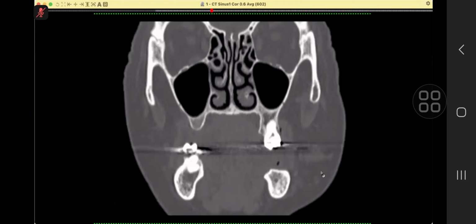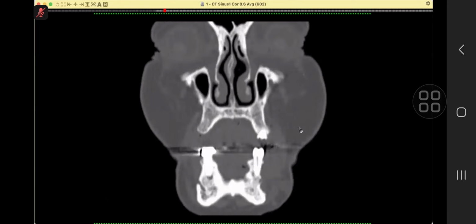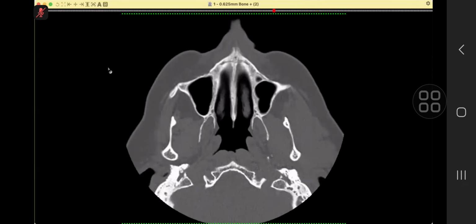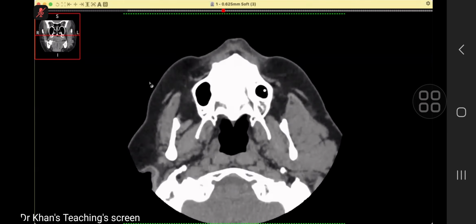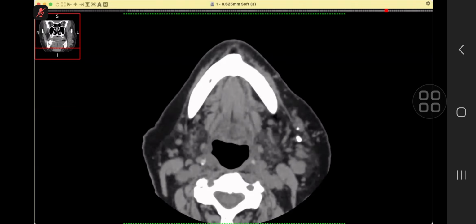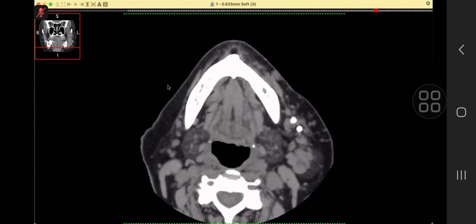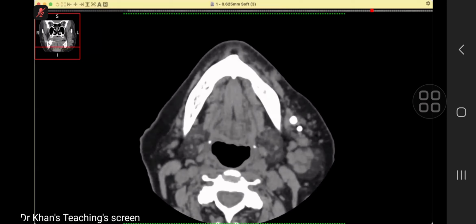Having said that, in your exam, I could have simply shown you this CT scan. On this CT scan, there might be sinusitis or no sinusitis, whatever, you pick up the phlebolith and then you make the diagnosis. One of the key points in a CT of paranasal sinuses is that on your PACS, the soft tissue window will also be sent. It's usual that people just see the bone algorithm, but you must review the soft tissue window also, though it is a non-contrast. So the phleboliths were there.